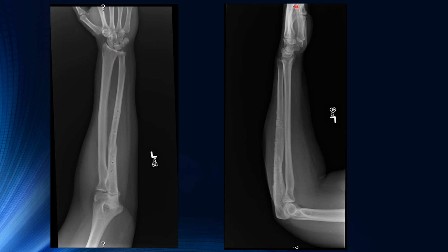Same thing with the lateral. It may not be 100% thanks to this fracture here, even though it's closed pretty nicely. Sometimes things just don't move the same they do anymore. The elbow looks really nice, and then it looks like we need to rotate our wrist a little bit, or it may not just go because everything else looks in a nice line.